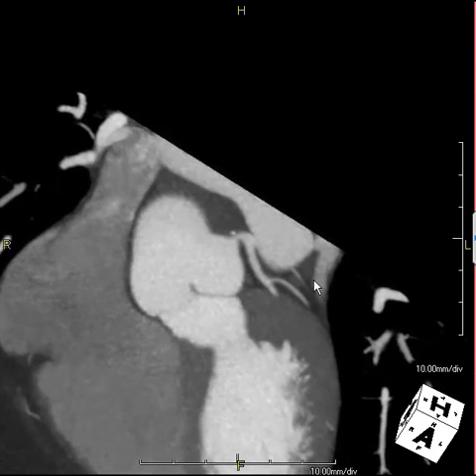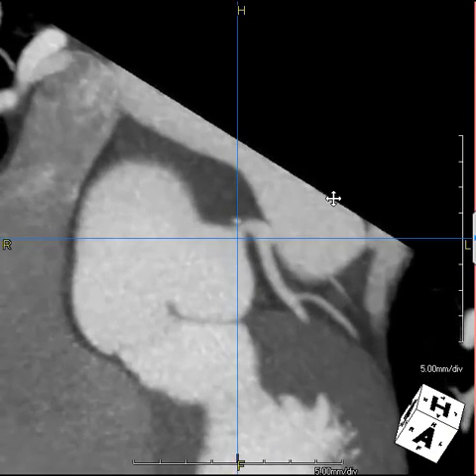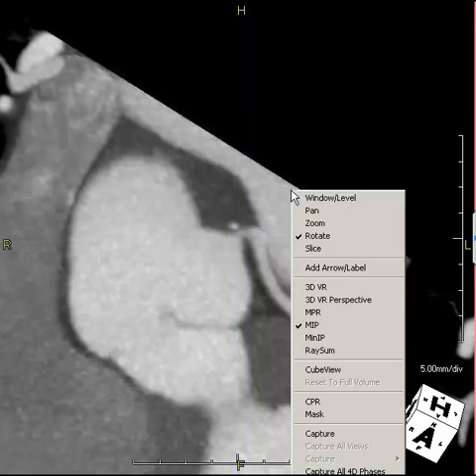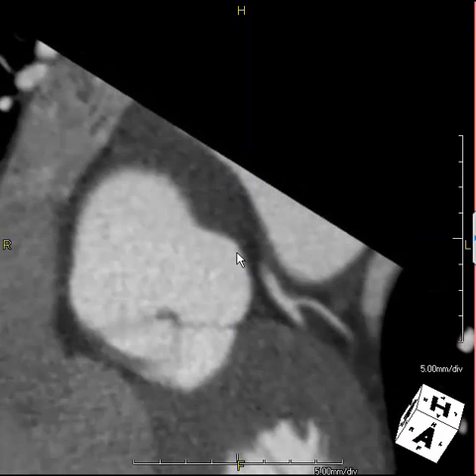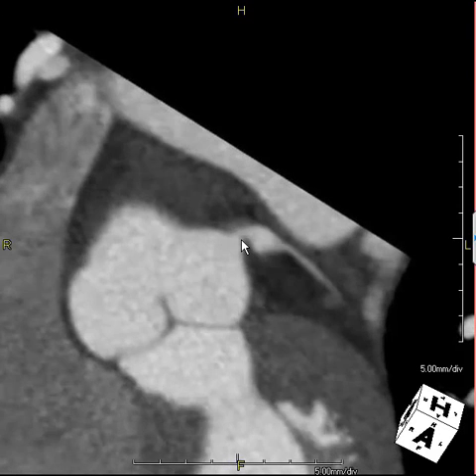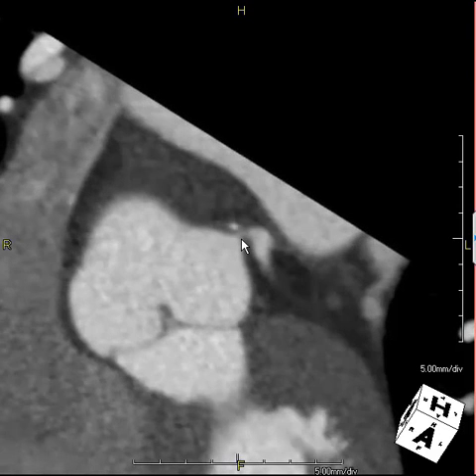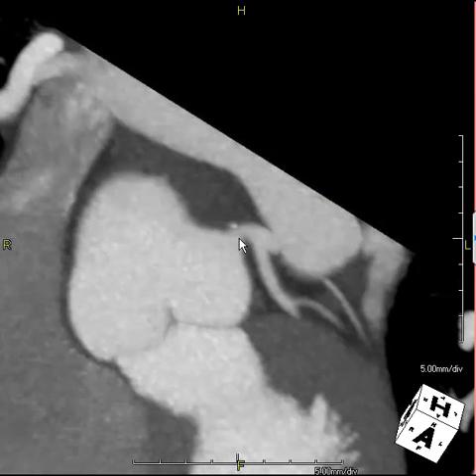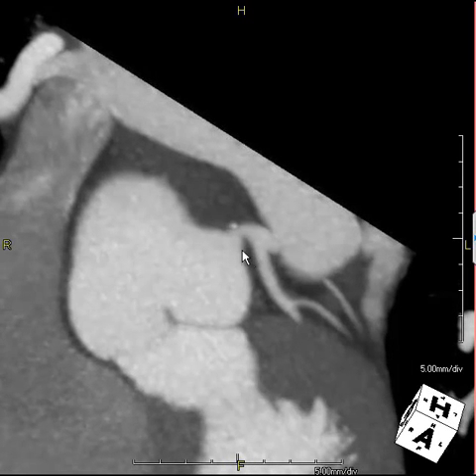If we examine her left main in particular, you can see that there is evidence of extra coronary opacification that suggests that this may be contrast media, but in review of the area of the left main, there appears to be focal significant obstructive disease, with the possibility that there is also some ulcerated plaque in this area.